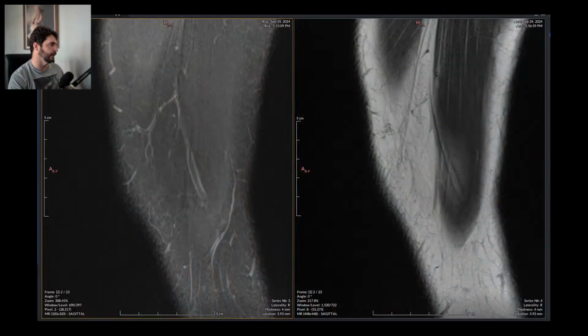I have maybe an hour until I have to leave for Jiu-Jitsu practice, BJJ practice, and we are going to report a few CT scans and MRI scans from the emergency, from the clinics. I have already downloaded a knee. Let me see here.